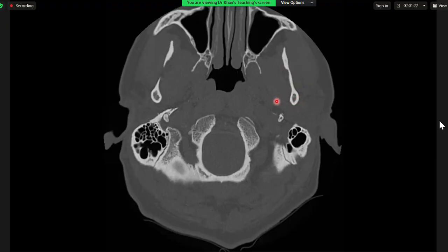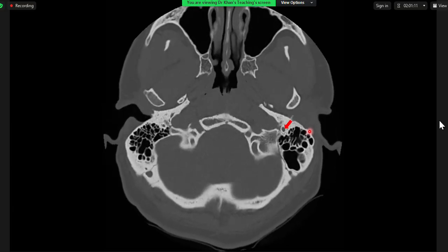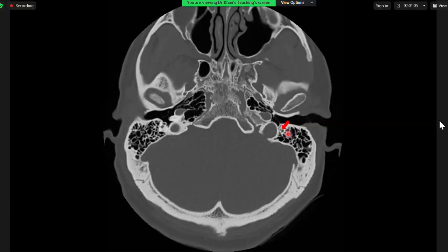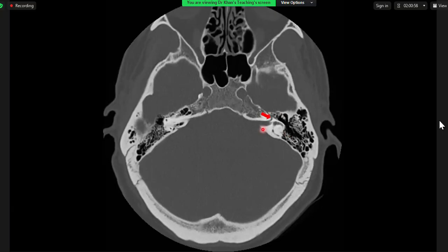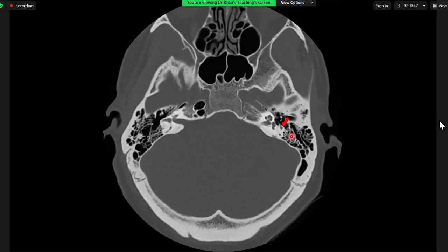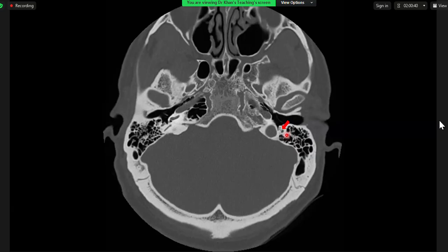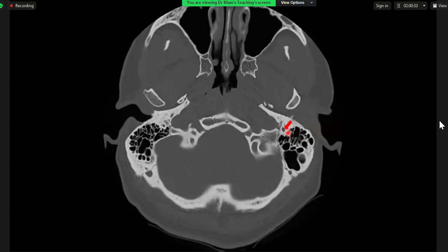Stretch your imagination. This is the mandible. So the parotid gland is sitting here. It will go into the parotid gland and will then give the final branches. So coming back, this was the facial nerve. Once again, quickly, let's see. Labyrinthine portion, geniculate ganglion, then the tympanic portion passes inferior to the lateral semicircular canal, passes posteriorly. When it reaches posteriorly, then it dips down 90 degrees. This is the mastoid portion or the vertical portion. It is going out, and ultimately out of the stylomastoid foramen.